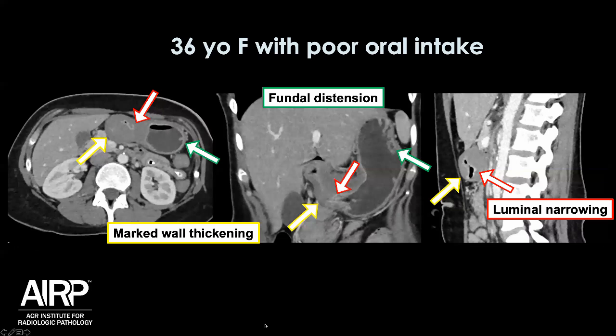The abnormality is primarily in the wall. When we have an abnormality in the wall, we want to see what's going on with the lumen, because our differential diagnosis is going to be adenocarcinoma versus lymphoma. When we see some luminal narrowing with evidence of obstruction, we want to think of adenocarcinoma first. That desmoplastic reaction causes narrowing associated with it. But the tumor is quite expansile and relatively hypoattenuating, right? We can see the mucosa here. We can see there's a little area of ulceration. I'll show that better later.